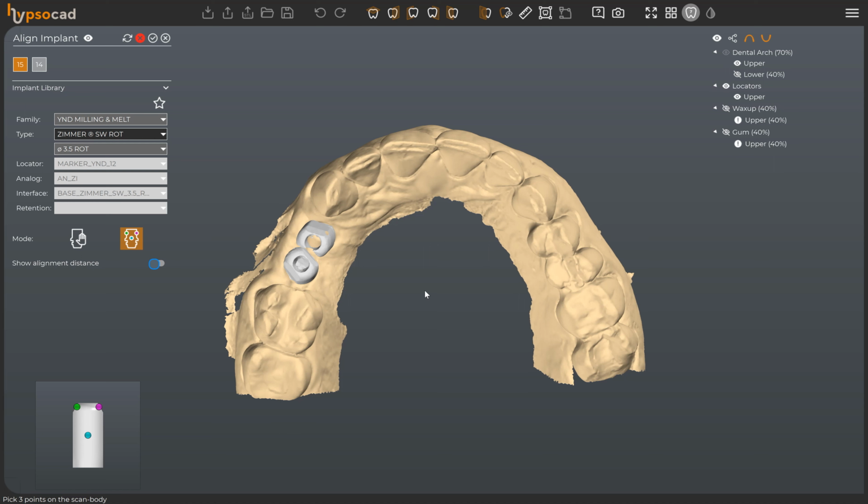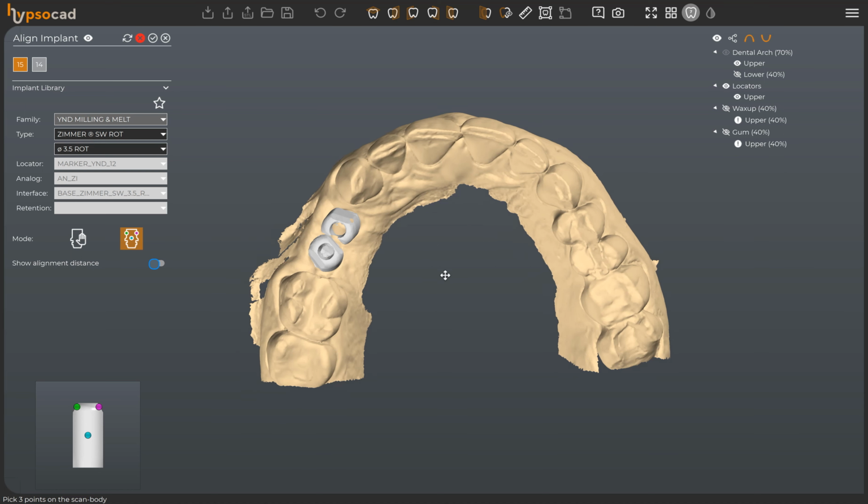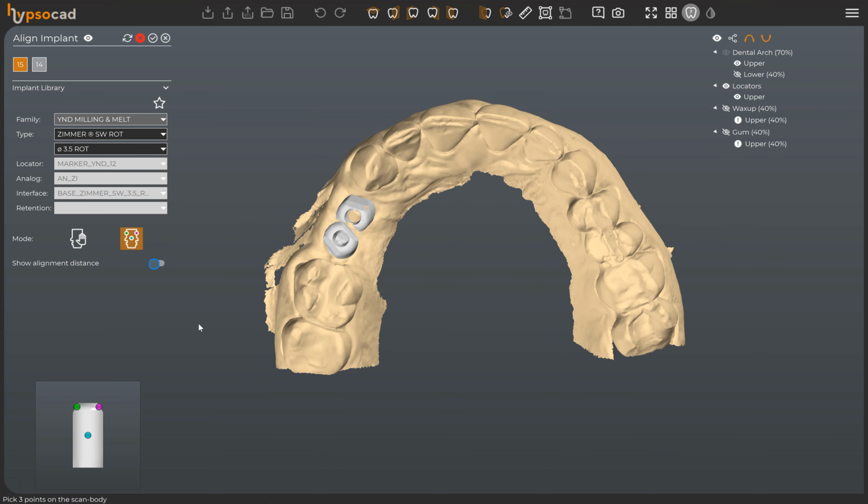If you would like to learn more about how to download implant libraries, we recommend watching the Order Manager video. You can find this video on our YouTube channel. Let us get back to our current job.